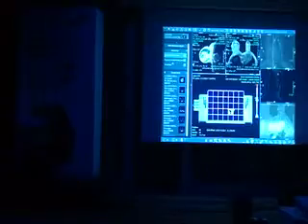I have here a demo of this grid for people who have never seen a grid in the breast coil, which is compatible with most of the coils from different vendors. And we can see here the squares which we can use to visualize and to approach the lesion in a proper way. Thank you.